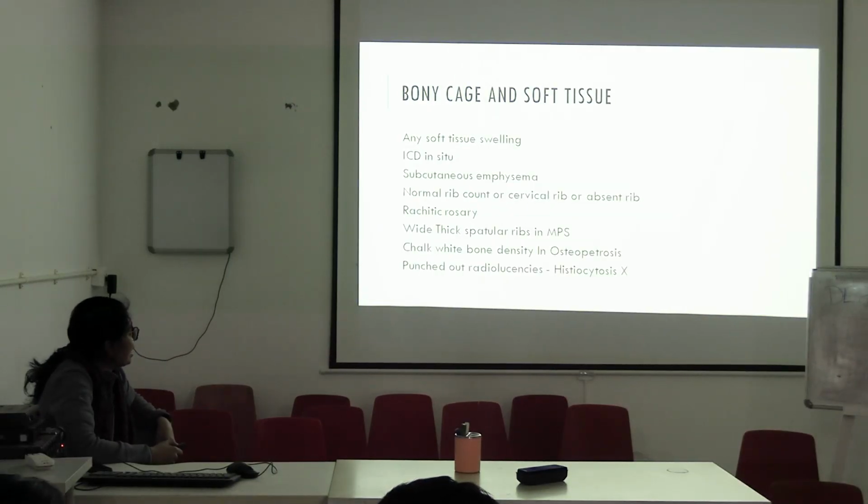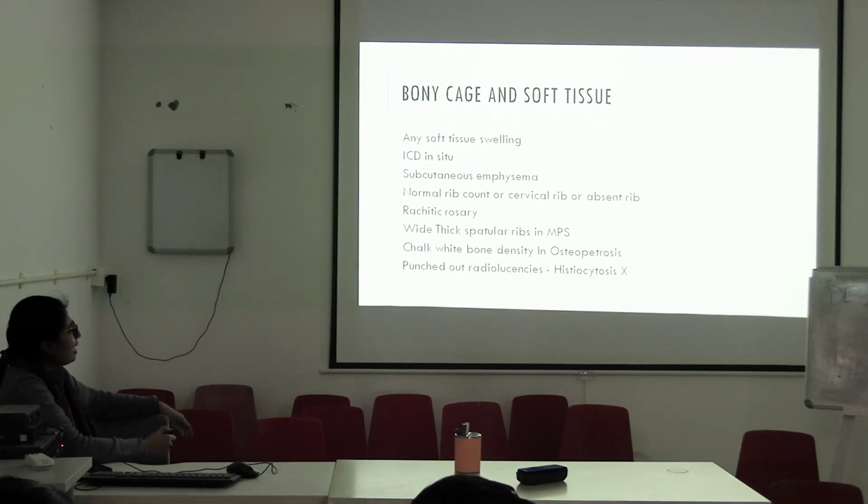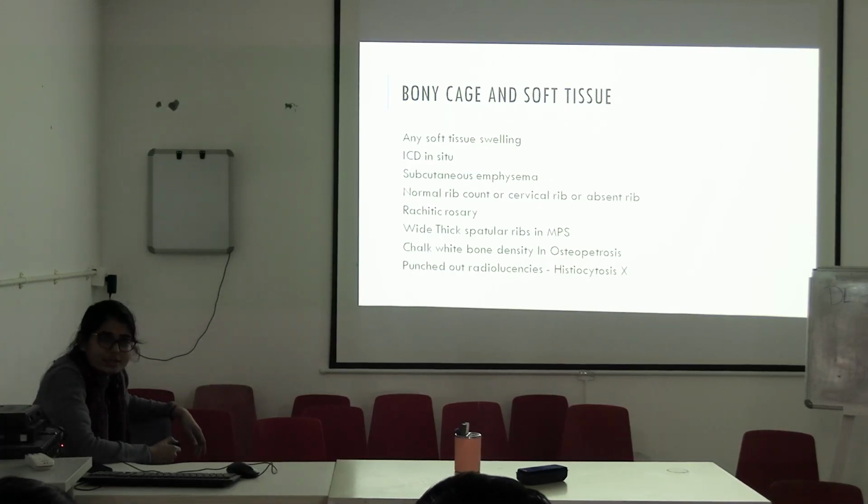So let's see, how will you describe the bony cage and the soft tissue? You will have to see whether there is any soft tissue swelling.